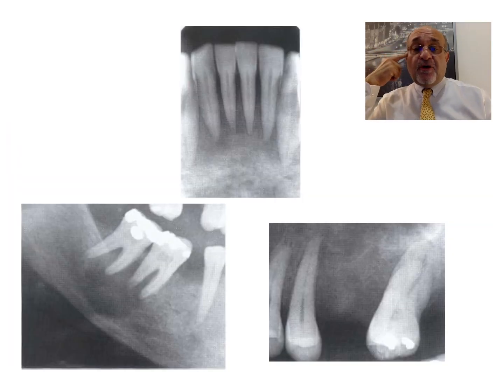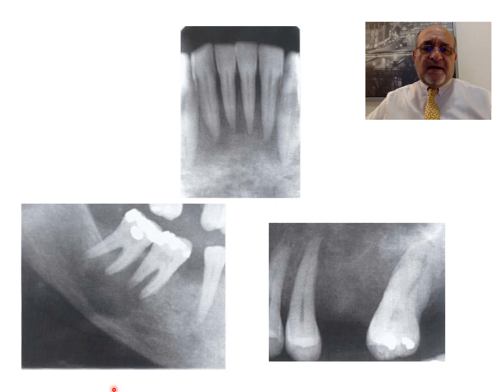When it comes to intraoral radiographs, the same thing is expected actually. This is a radiograph of lower centrals. See the complete absence of the lamina dura. This still appears to be a normal architecture of the bone trabecules, because this is the mental ridge over here, but here, have a look at this area. The trabecules don't appear as they should.